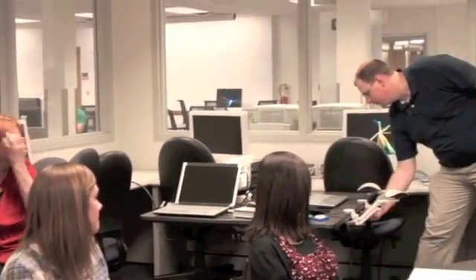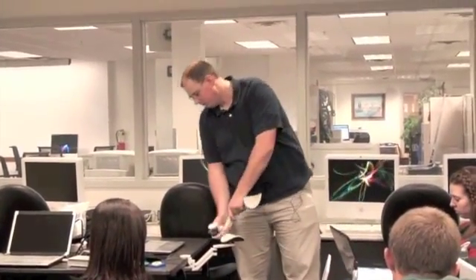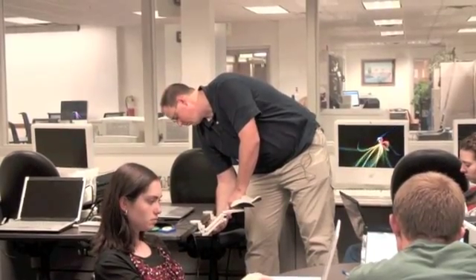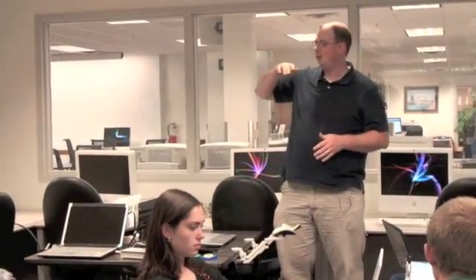Examples of that, the armrest where you can mount it to a table. This gets mounted onto the table. So I just got a tightening screw. Slides on. So they're mounting devices. It is a mounting device, yeah. Usually when I'm thinking mounting, I'm thinking putting something on a screw and keeping it there on a wheelchair and leaving it there. Nice thing about this one is it goes on and off so fast. So if I need to move it between places, it takes me 30 seconds.